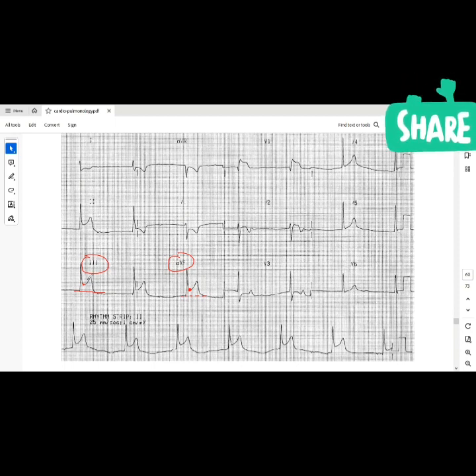Which one is lead 2? Is it V2 or 2? Wait, is this right here? I can see your cursor. Which one are you pointing to with your cursor? Okay, the one next to lead 2, the one right after. This one. Yeah, so that's AVF.